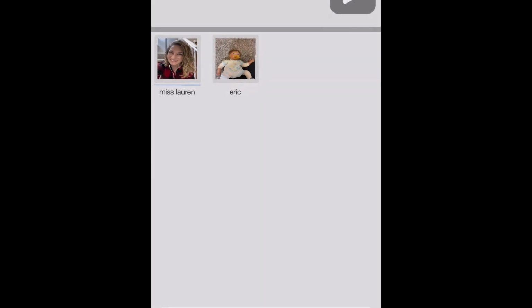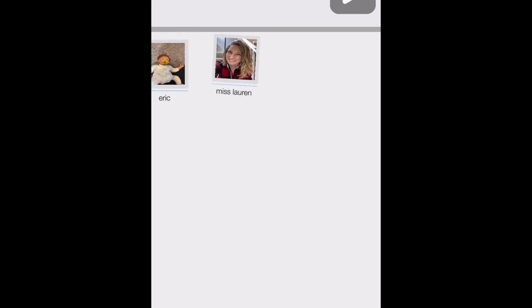Rename. Nope. Okay. But you can change the position. I'm not exactly, again, I have not done. All right, there you go. You just hold it and click it and move. So you can change position.